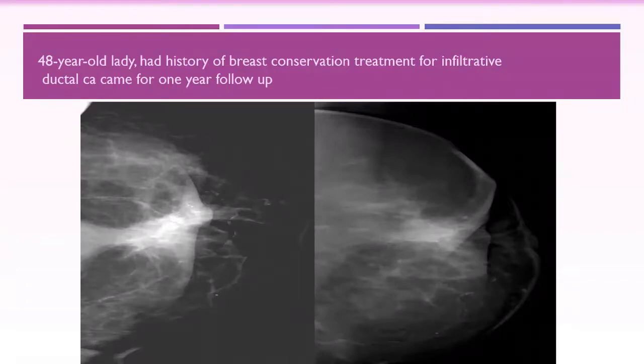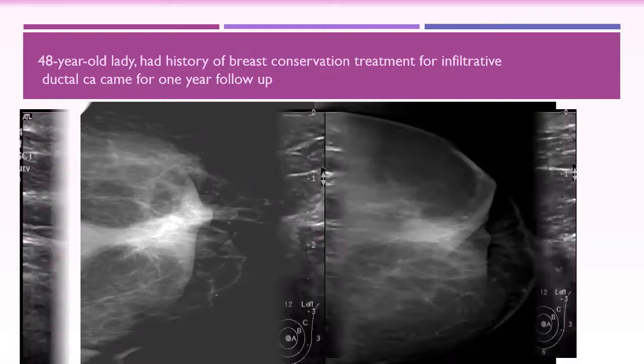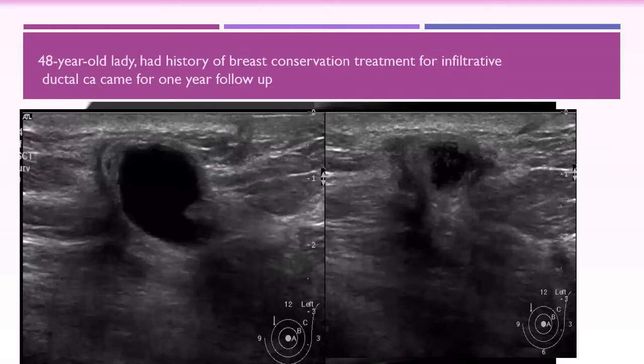Okay, but it's getting less, so you suspect more fat necrosis. And what about ultrasound, does it help you? This is the previous one, and this is the recent one.